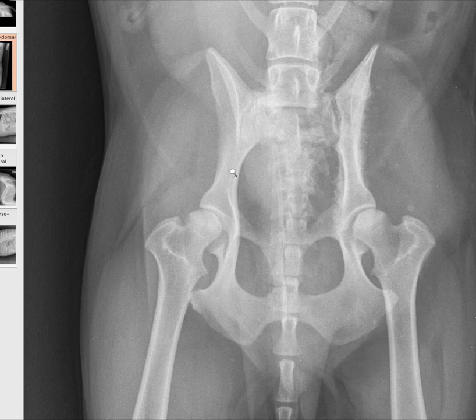One of the first things that I look for when I'm assessing if a lesion is aggressive or non-aggressive is whether or not there is a periosteal reaction, as well as what type of periosteal reaction I see. So in this case, I can see that there's a periosteal reaction, especially visible on this view on the ilium, and I would characterize it as irregular. That means that if I were to try to trace the periosteal reaction, not only is it difficult to trace and ill-defined, but I actually end up moving my mouse sort of back and forth along the long axis of the bone, more so than progressing longitudinally.